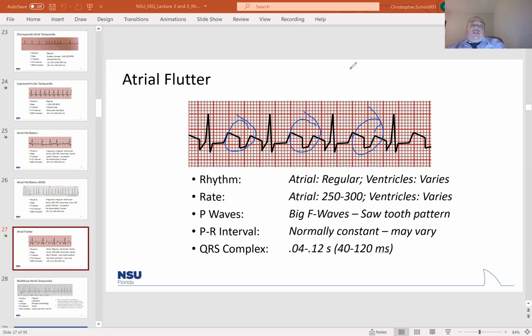Your rates are going to really just depend. Like the longer conductions, it's harder for them to get tachycardic, right? Because if you have 4 flutter waves in between each QRS, it's just simply going to take more time for those flutters to occur, which is going to push the QRSs farther apart from one another, which will make this rhythm a little bit slower. So you usually see the faster A flutters in A flutter 2-to-1 because you don't need as much space in between those QRSs, okay? So A flutter 2-to-1s can present with a little bit higher rates, getting 150s and up ventricular rate. That's where you start getting into problems.